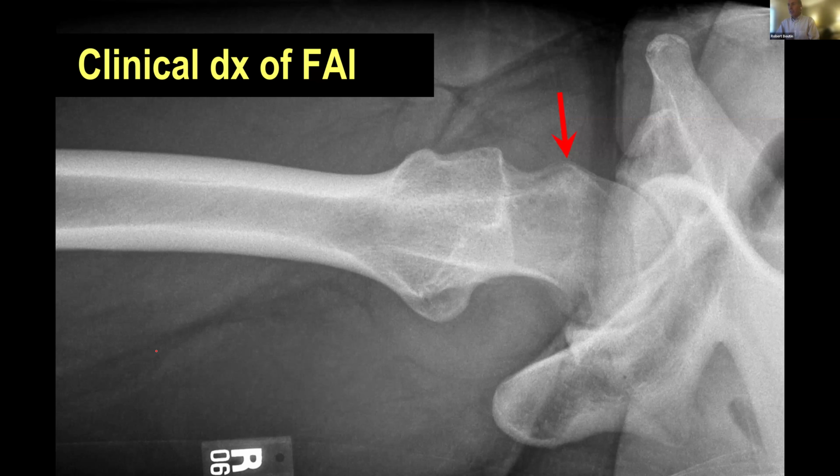Maybe the meniscus is extruded, they have a posterior horn root tear, and there's biomechanical overload of the medial compartment, and they get a stress fracture in the medial tibial plateau, again just looking like a band of sclerosis, in this case horizontally oriented, due to typically medial meniscus dysfunction and medial compartment biomechanical overload. But I'm not aware of the tibia being affected by bisphosphonates. But if you have a case, I want to see it.